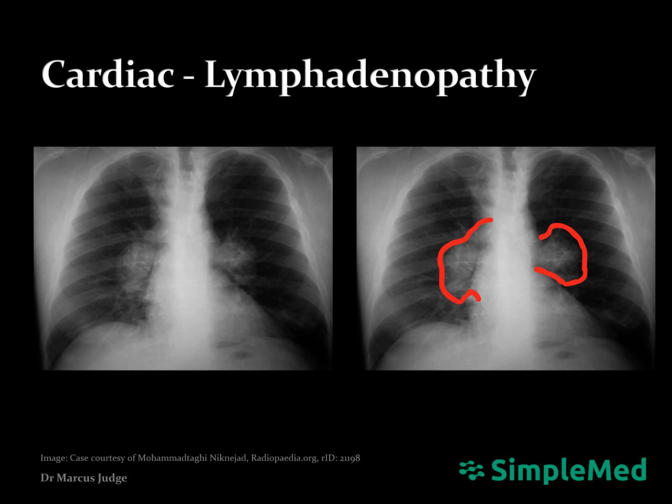Enlargement of the lymph nodes in the chest can be a sign of multiple pathological conditions. Of particular importance are the hilar lymph nodes, which can be seen clearly when enlarged on a chest X-ray. Hilar lymph node enlargement can arise from many causes, which include infections such as pneumonia and tuberculosis, malignancy with lymph node spread, sarcoidosis, and also inorganic dust diseases such as silicosis. The chest X-ray shown shows large bilateral hilar lymph node involvement in a patient with sarcoidosis.